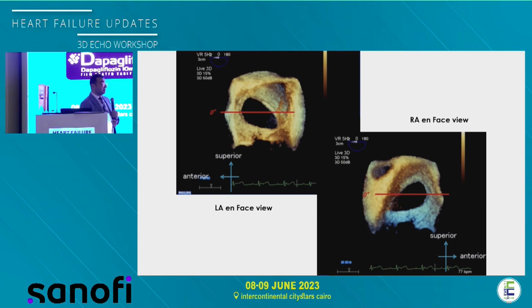Making sense. But sometimes your angle is not aligned to get the widest diameter, like you are seeing here. When you look at it in the 3D, you are taking a measurement and you consider it's the widest, and actually it's not the widest.